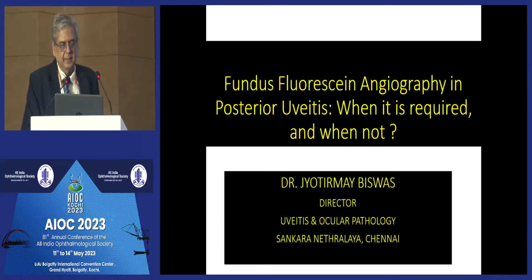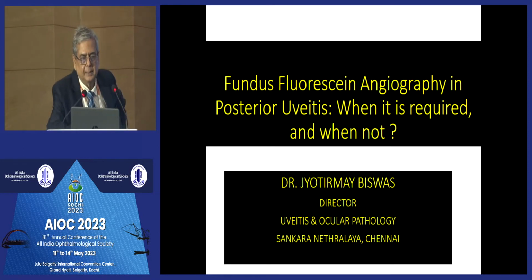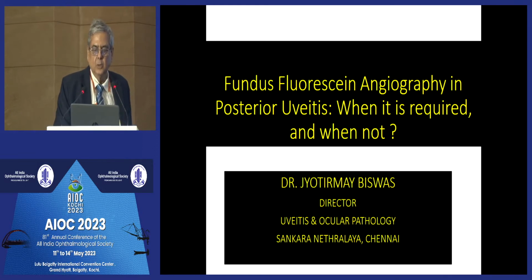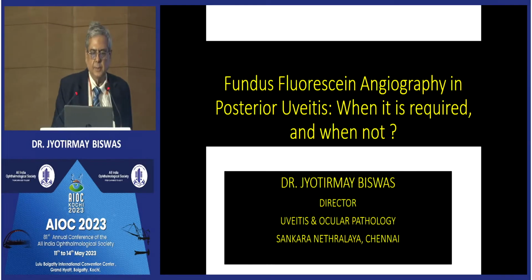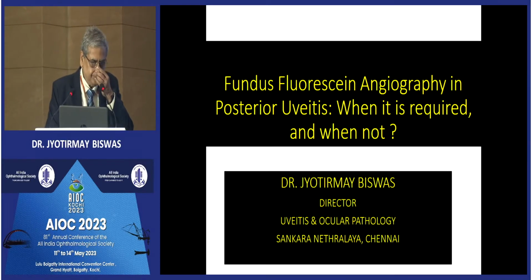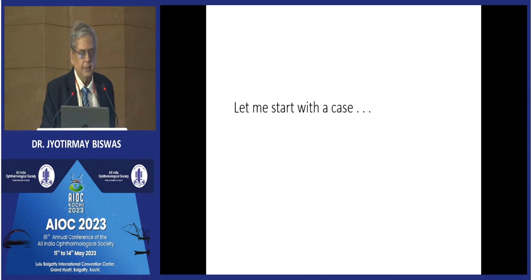I'd like to thank Dr. Rima for giving me this opportunity and particularly asking me to talk on fundus fluorescein angiogram in posterior uveitis: when it is required and when not. I started using fundus fluorescein angiogram about 30 or even 35 years ago, and at that time serpiginous choroiditis was one of the most common indications for me, and Eales disease. Over the years, I learned a lot about fundus fluorescein angiogram in posterior uveitis. I'll just share my cases.